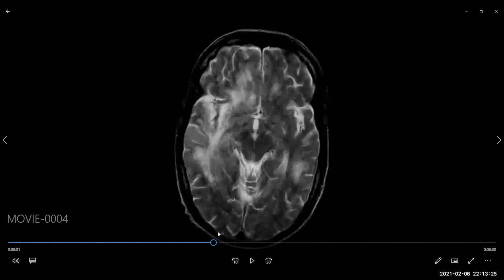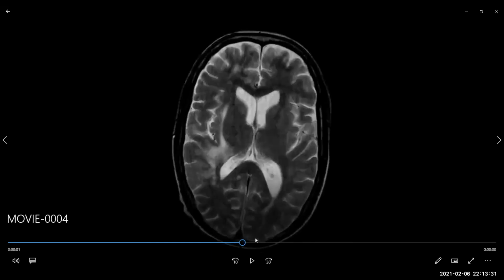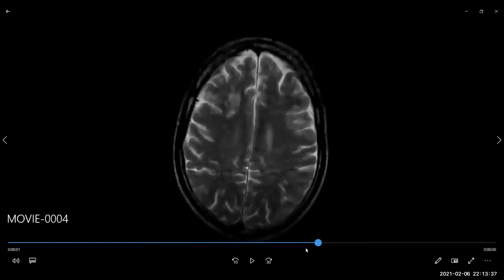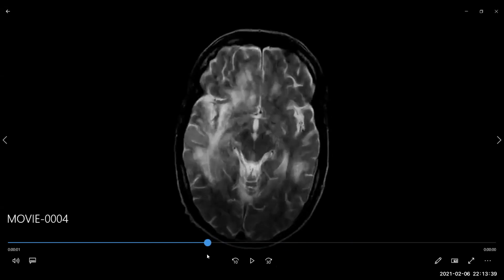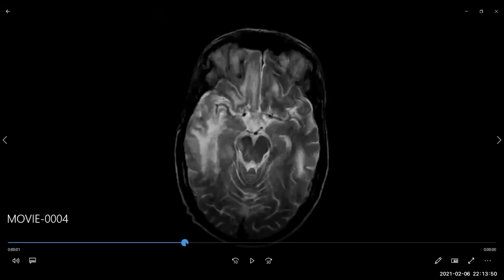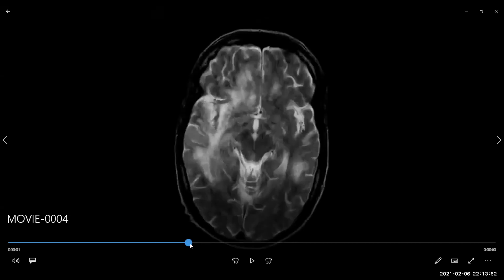This is a T2 weighted image where the involved areas are T2 hyperintense. There is diffuse cortical swelling at the involved areas with subcortical white matter T2 hyperintensity. It's predominantly on one side, but there is some involvement of the opposite side also.